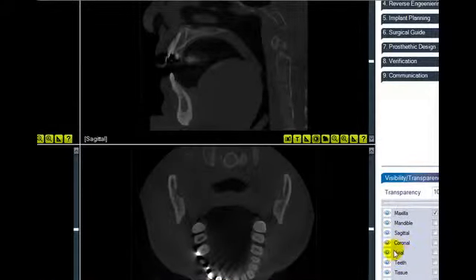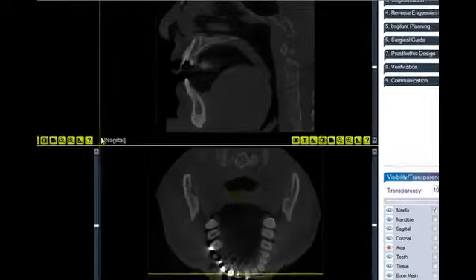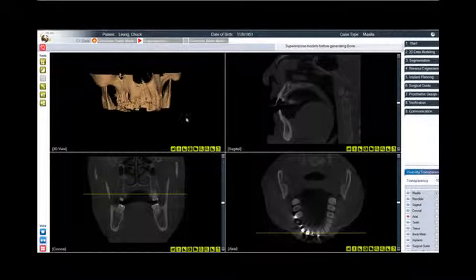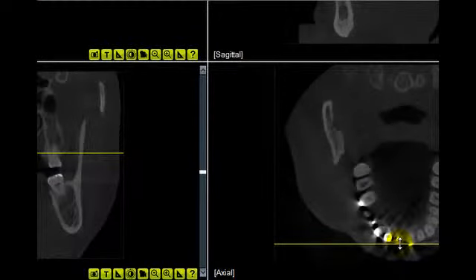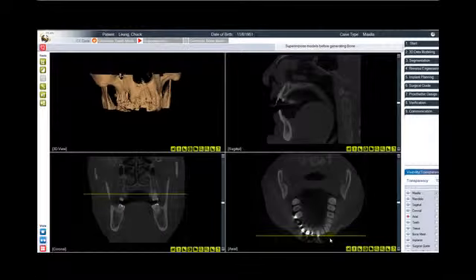So if we look at the axial slice relative to the viewer right there, again we notice that there is a very thin buccal plate right around this yellow line that we have in here. So once again, extreme caution when this root is to be extracted, so that you do not obliterate the buccal plate. And if that happens, then you would have to graft the site, put a membrane on it, and go back and attempt to place the implant at a later stage.